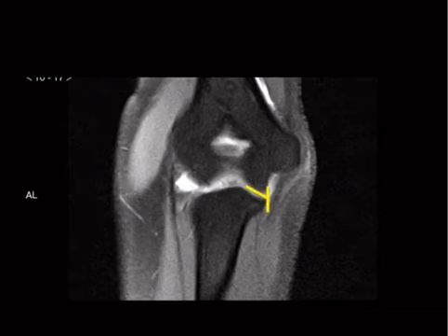This is a partial UCL tear. There are 3 bands to the UCL. The anterior band is the only one that really matters. It's the, quote, important one. Who do you see this in? You see it in throwers because they do a valgus overload where they bring their thumb. So what does valgus overload look like? If you can imagine taking your thumb and trying to reach all the way behind you with it, it's sort of a valgus overload, but like stretching out palm up, reaching backwards with your thumb. That's what throwers do when they wind up.